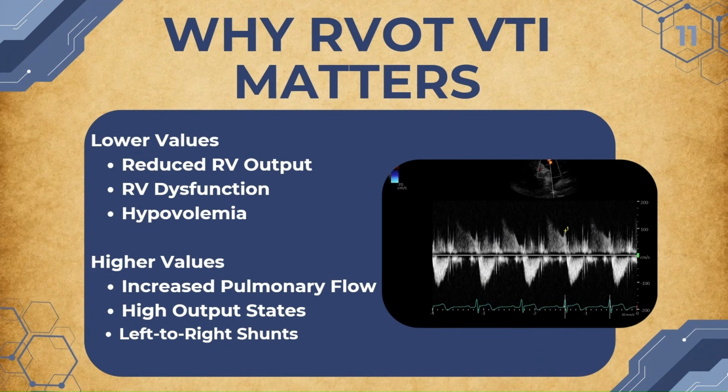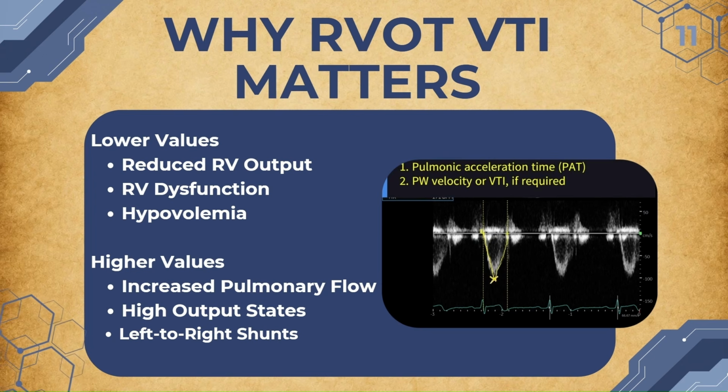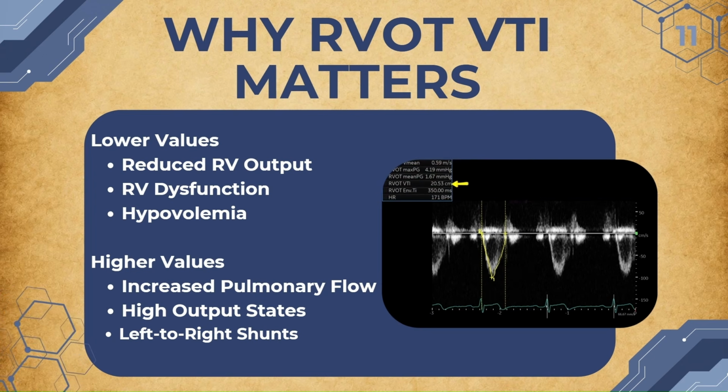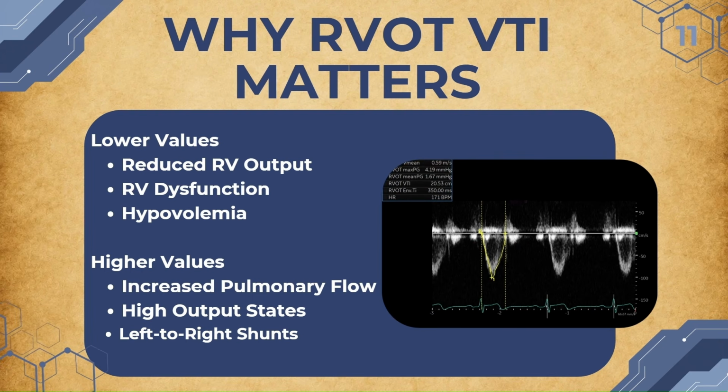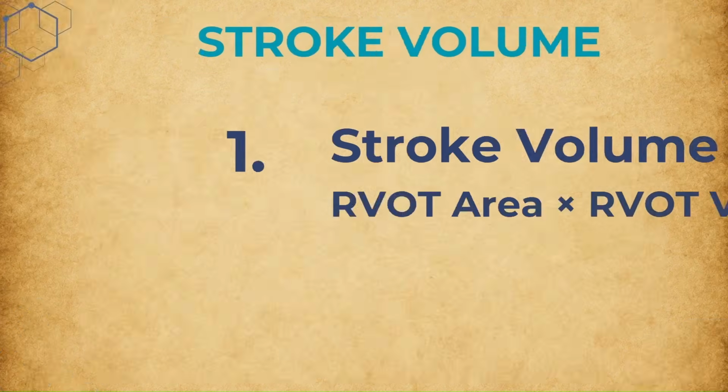Why RVOT VTI matters. RVOT VTI provides physiologic information about forward flow. The measurement itself is useful. Understanding what it represents is even more useful. Always interpret the value in the context of the patient's clinical picture.